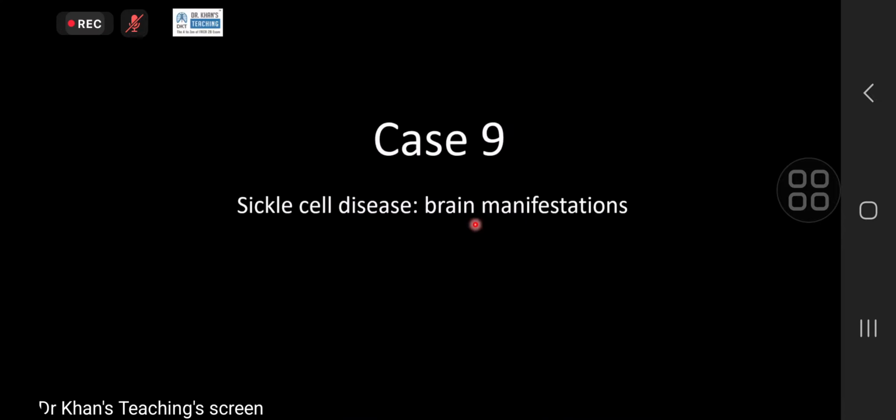Now let me go through it. Sickle cell disease. You see, I am now showing you the same disease with a different manifestation, and I did it intentionally.